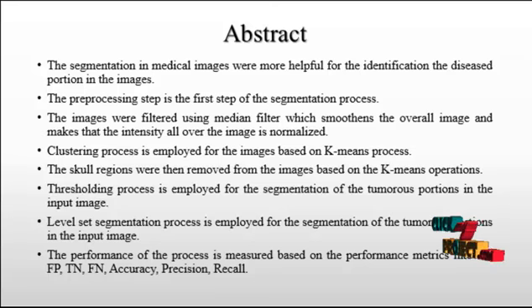Finally, the performance analysis is based on metrics like true positive, false positive, true negative, false negative, accuracy, precision and recall. The automation of this process is useful for post-processing of the extracted region of interest, like tumor segmentation. This is applied to structures based on pixel intensity, while the HCSD allows selecting only those having a specific shape.